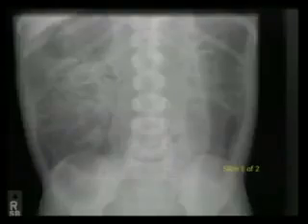Does this look normal? I hope you say not. The colon is massively dilated. What do you notice, Yemisi, about the colon? What's it called? Look at that. All these little air bubbles. This is not an erect view, but look. All these little soap bubble pattern. That's in the front of the wall or the back of the wall that you can't see.